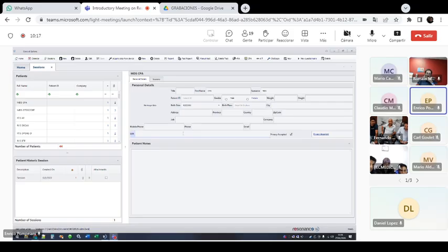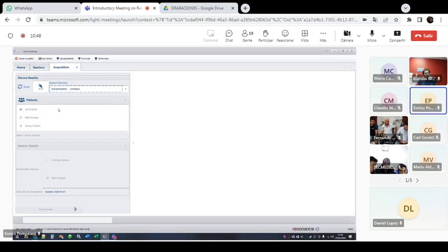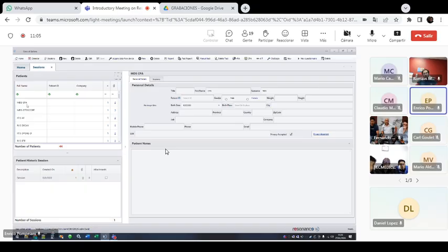There is nothing more to add to what we have just seen, except that you don't necessarily need to create the patient also in MDS if you are using an R14O and you have created the patient on the device instead, because I can use the acquire data from device page to acquire automatically all the patients and the examinations on the R14O with the MDS, and I will have them already stored inside the MDS.